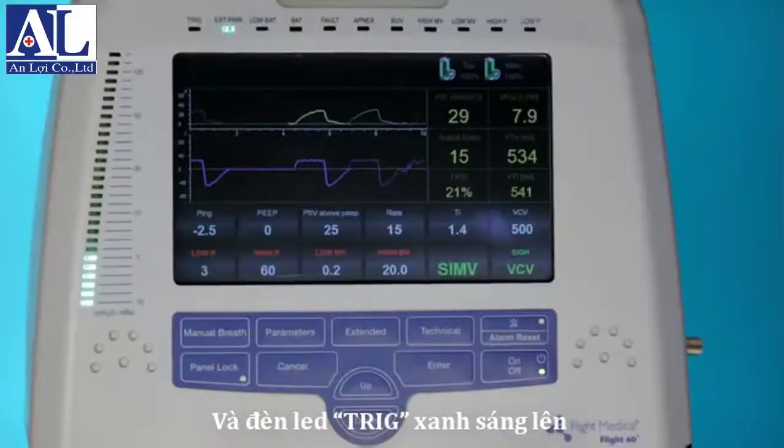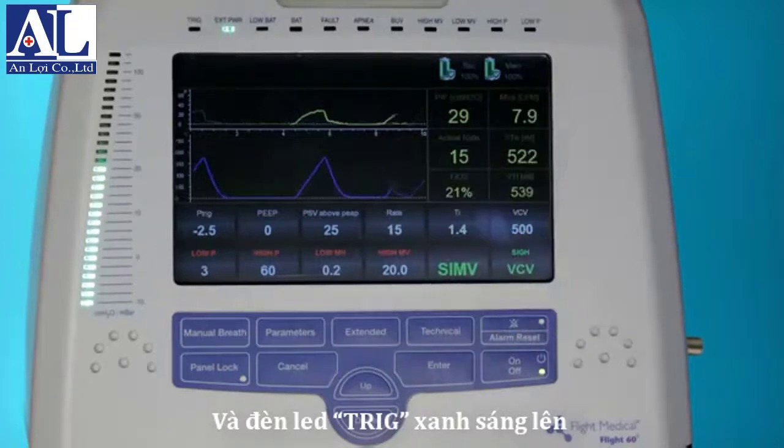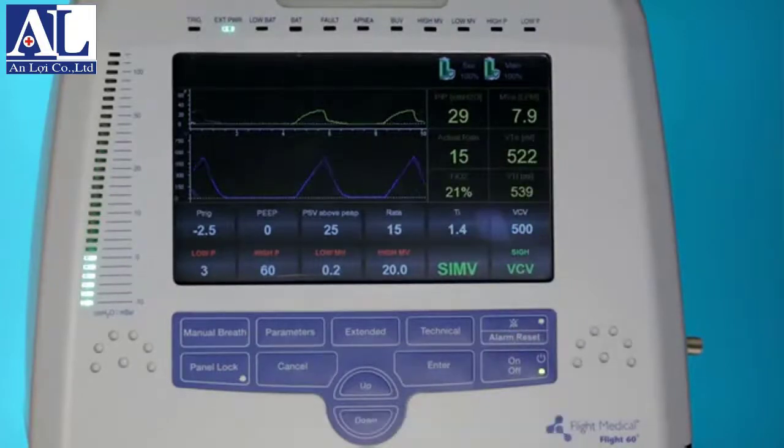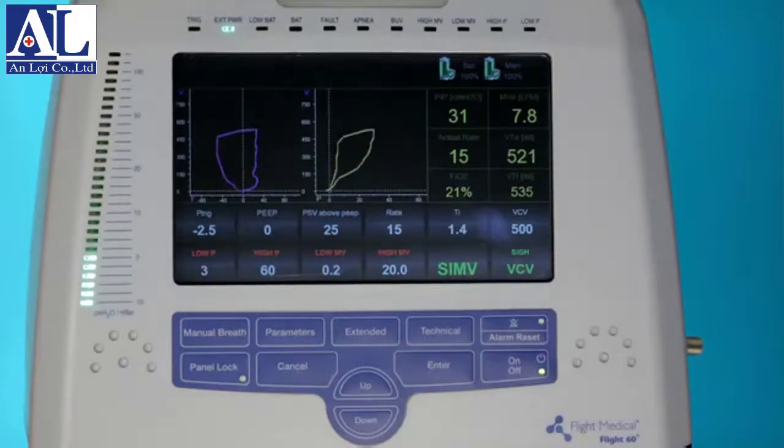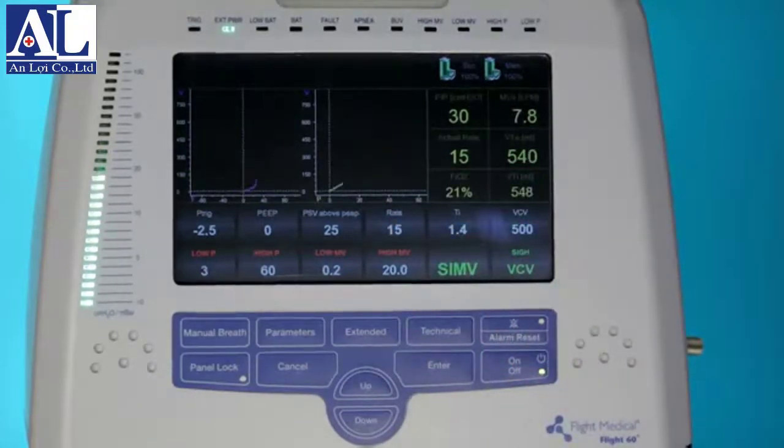By tapping the screen, a blue volume waveform will replace the flow curve. By tapping the screen again, loops are displayed: the yellow pressure volume and magenta flow volume loops. When a breath is triggered by the patient, the yellow pressure volume loop changes color to green. Scaling of waveforms and loops to fit the screen is automatic.